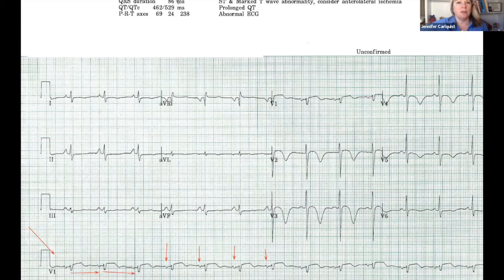And we also can look over here and see in the PR interval that there is a P because it is being measured by the machine. So that's just a double confirmation, because remember, if there isn't, you'll see an asterisk here. So the next step after rhythm is intervals, going down and looking at all your intervals to make sure they are all normal. So yes, PR interval is normal. QRS is normal and skinny.